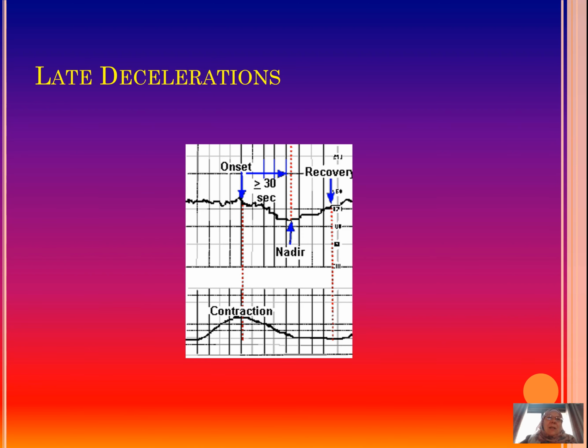Late decelerations, on the other hand, usually start at the top of the contraction when the contraction is the strongest, and then it takes a long time to come back to the baseline, to normal, after the contraction. These are a pathological feature that is worrying, and that shows that the baby has got a reduced fetal reserve and cannot compensate with the contractions very well.